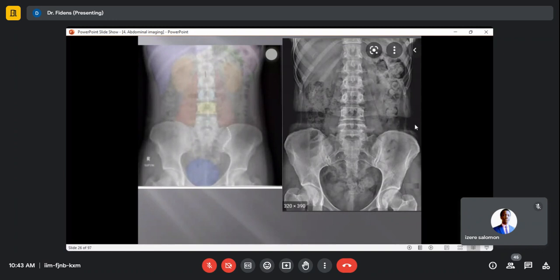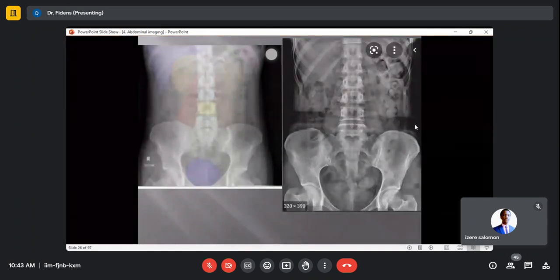Lecturer, question. What about the collimation? You say that it's not good. On plain abdominal X-ray, remember, what have I said for collimation? What do you have to check for? Check for the spinous process and the sacroiliac joint. So your collimation is correct.